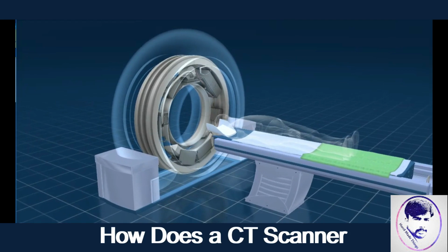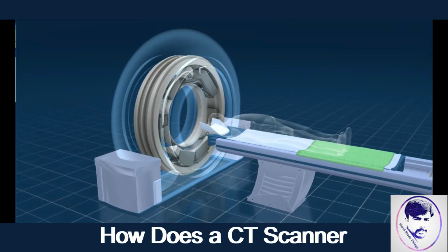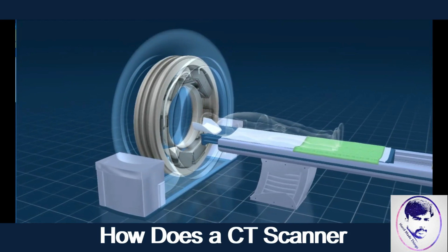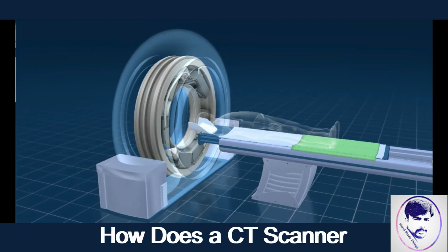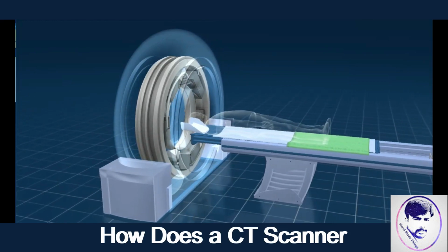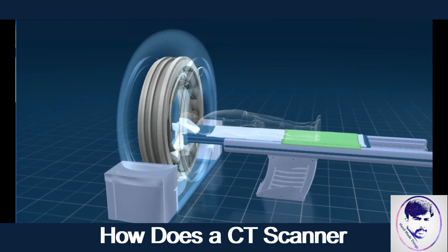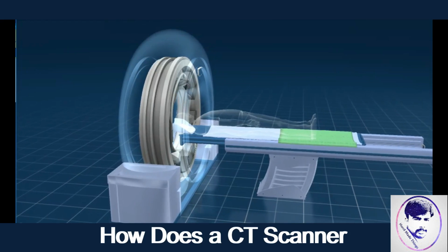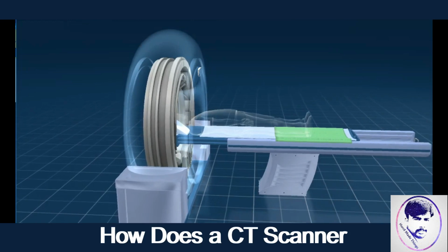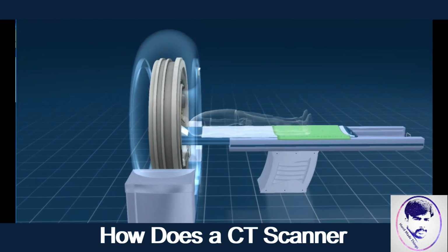Computed tomography is a technique used to obtain digital cross-sectional images of the body. The CT scanner measures the amount of radiation absorbed in each area. The body is scanned from several directions using a rotating ring that contains an X-ray tube and detectors on the opposite side. The multiple measurements performed during one rotation form an intensity graph that helps map the given plane in detail. When a slice is completed, the motorized bed moves slightly and another cross-sectional scan is taken. The intensity graphs of the slices are then assembled by the device, forming a 3D image of the body.